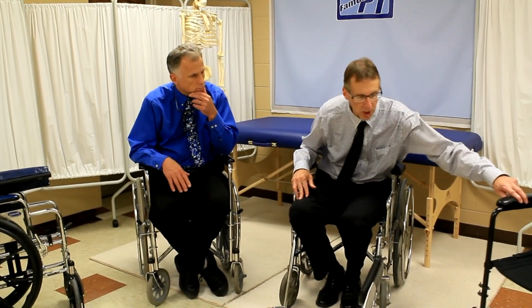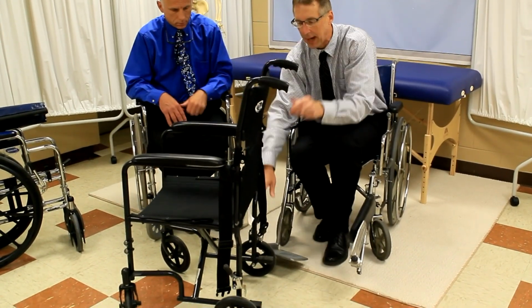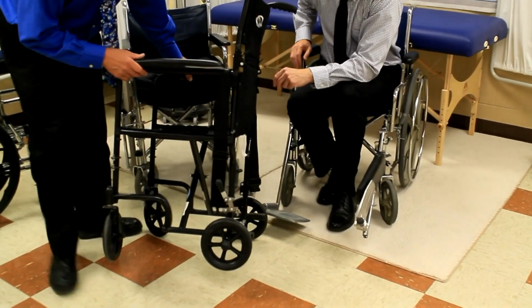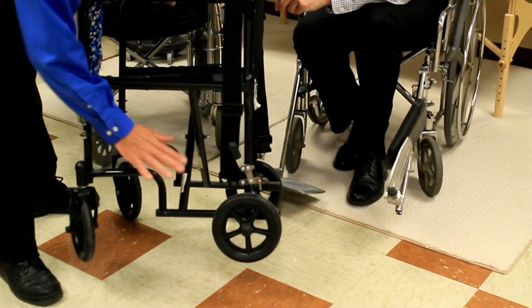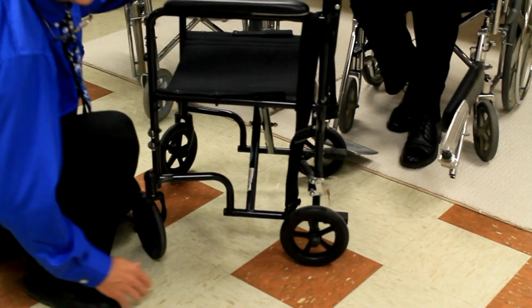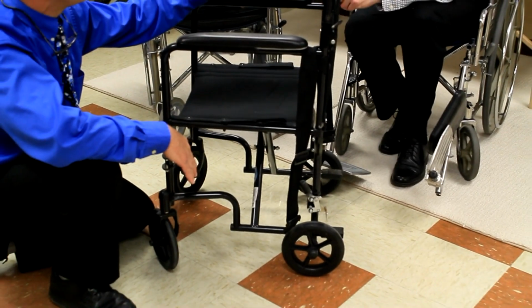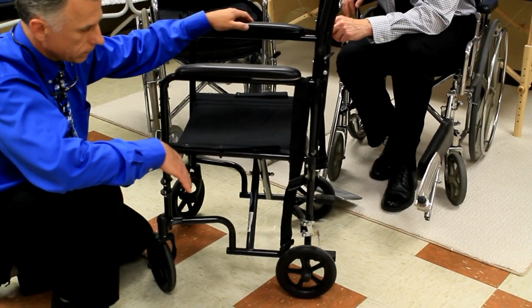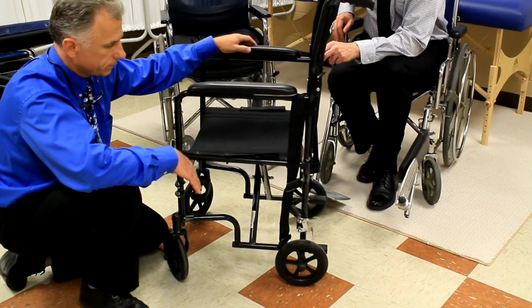There's a transport chair. Now, the big difference with a transport chair is, you can see on the back, it's got small wheels. Can you pick that up, Lonnie? They're 6-inch wheels, and they're really nice in a house or a facility that has hard floors, but over carpet, they're significantly harder, and to get over thresholds is quite a bit harder too. Right, or if you take it outdoors, you're gonna struggle. On any sidewalk or driveway, or gravel, it's gonna really run hard.